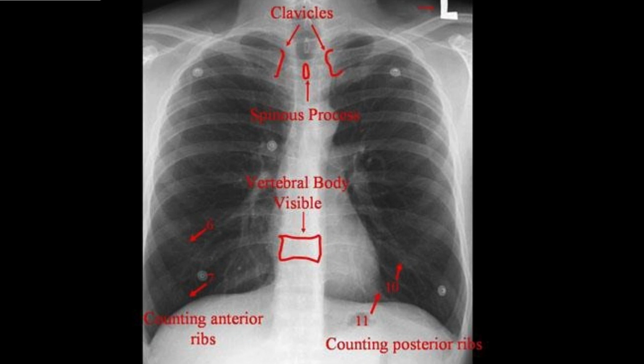And in this image, we can see clearly all findings of RIPE technique. So I will give you some time to recap all.